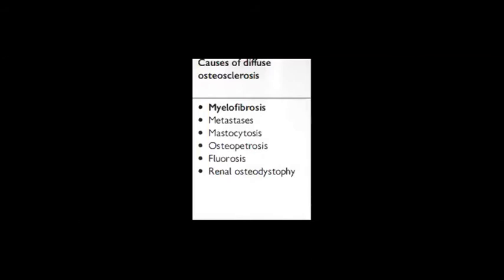As we mentioned, it is one of the most important causes of diffuse osteosclerosis and bone marrow replacement. So there is replacement of the normal marrow.